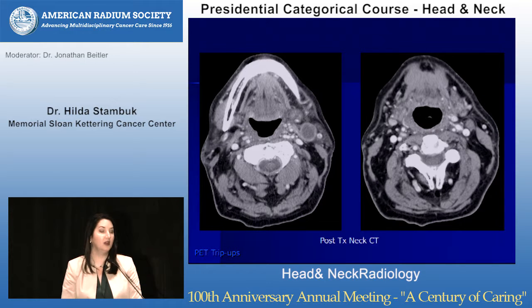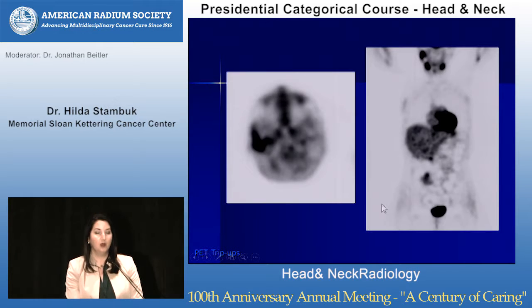And why did I throw that in there? It is to remind you that parotid tumors, the benign ones, Warthins and pleomorphic adenomas, are very FDG avid. Don't use PET to help you differentiate between a benign versus a malignant lesion in the parotid gland. Why am I showing you this? Because PET's our friend, but we have to realize how to use PET and not trip on it.